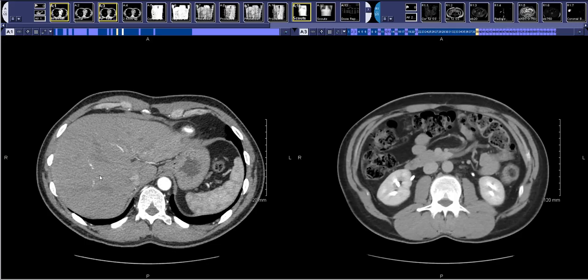Kidney donor CT scans are done for patients that are considering donating a kidney to a loved one, and as such you have to rule out certain anatomic variants to make sure that they're not going to be at risk if donating their kidney, as well as to help the surgeons decide which kidney to harvest for donating.